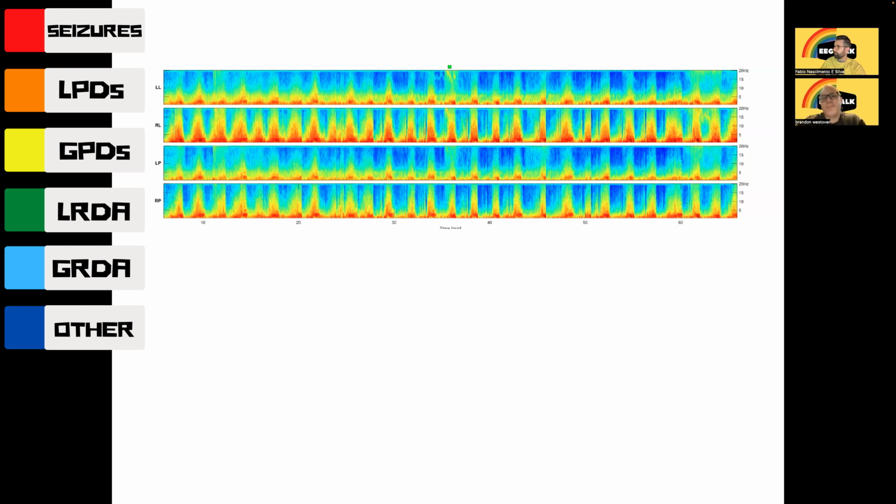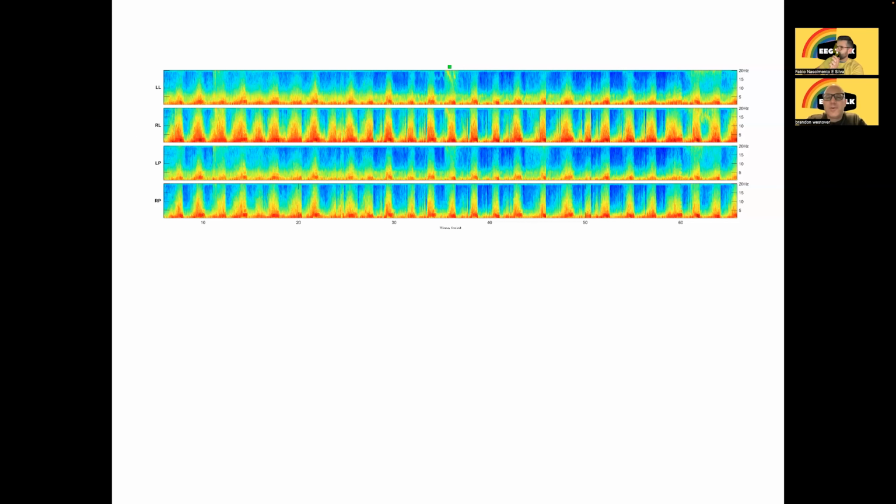So you've got to try to guess what you're going to see. This looks really pretty. So what could possibly be going on here? There's a lot of flame-looking things, a lot of hills. Actually, we do call these little patterns flames, by the way. In fact, we call them regular flames, to contrast them with choppy flames or irregular flames. You'll see some that are much more jagged in later slides, but these are regular flames.